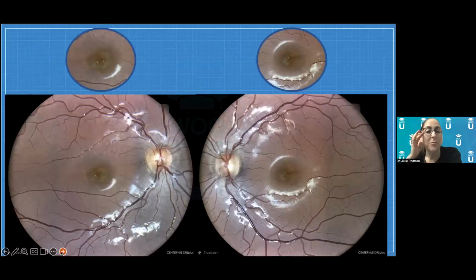And this was the clinical presentation. So I magnified on top here what was of clinical importance on fundus exam. So hopefully you can appreciate that this patient has what looks like a bullseye maculopathy. So essentially there's a depigmented area surrounding the fovea, and it really highlighted very nicely on the photographs. The white part is really just an increased light reflex, if you want to say, or sheen of the ILM in a very healthy young patient.